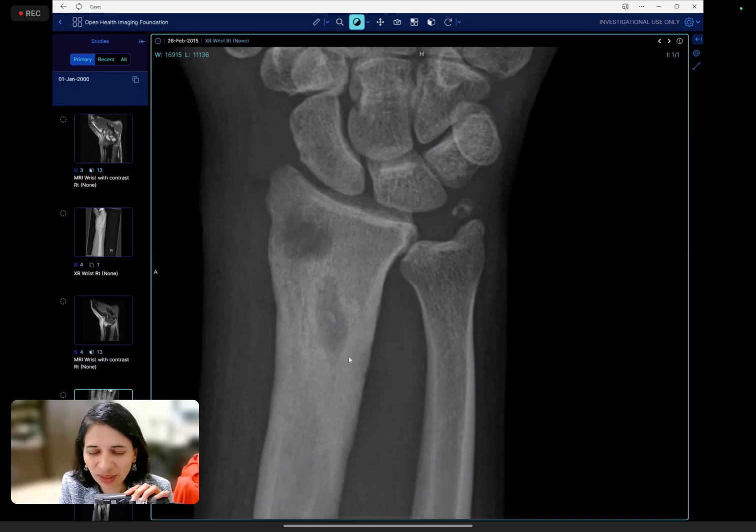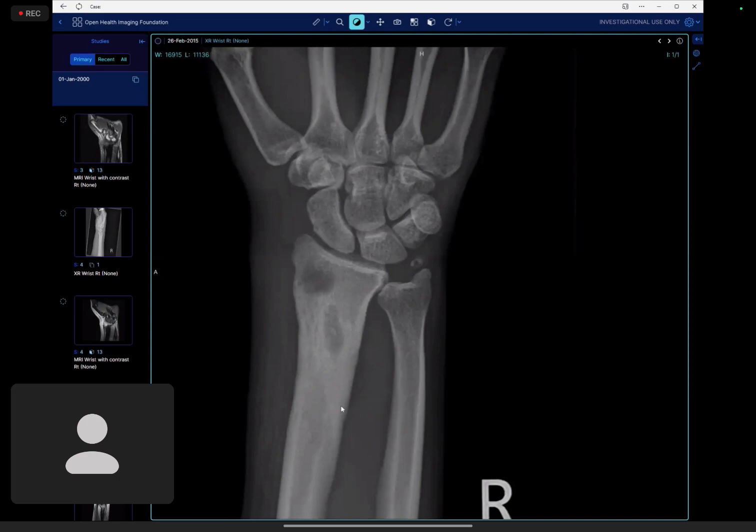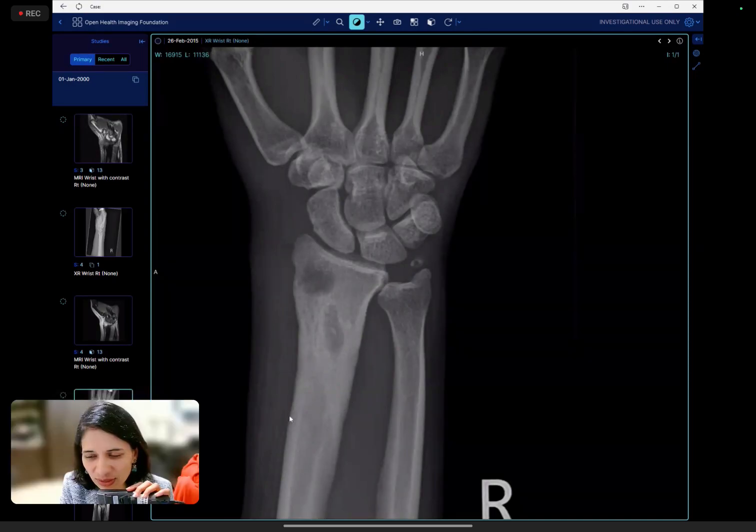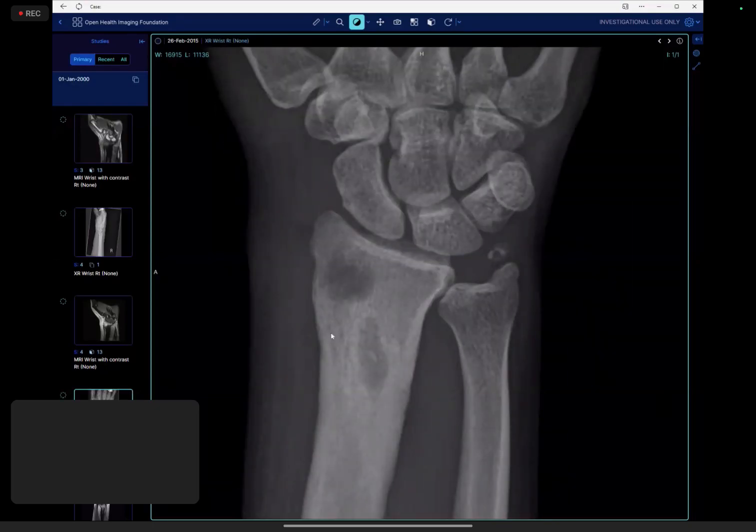I think. Lung mets is a good thing, but suddenly getting two metastatic deposits, very rare, isn't it? Yeah, very rare. And increased sclerosis. See, the bone is abnormal actually from here till here, and having so much soft tissue swelling. Yeah, actually, infectivity should be the first top differential.